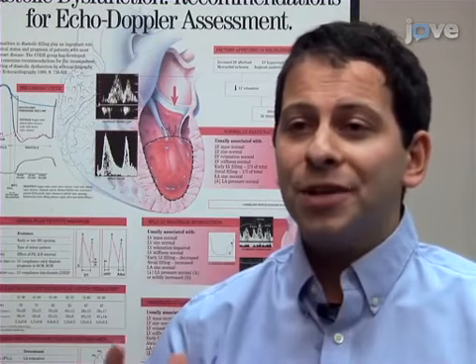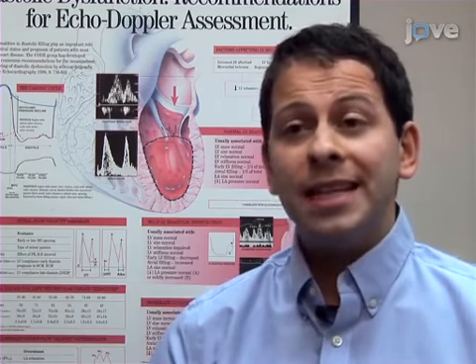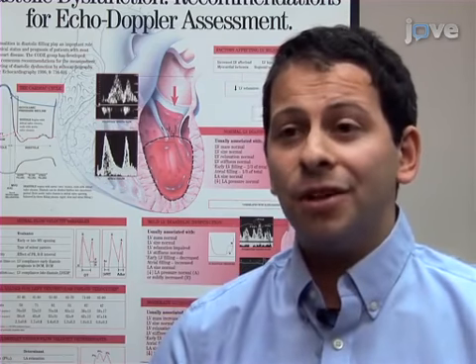The main benefit of the PDF technique is that it marries Newton's laws of motion with the actual suction pump physiology of diastole in order to extract physiologically and clinically relevant diastolic function parameters from the waveform itself.